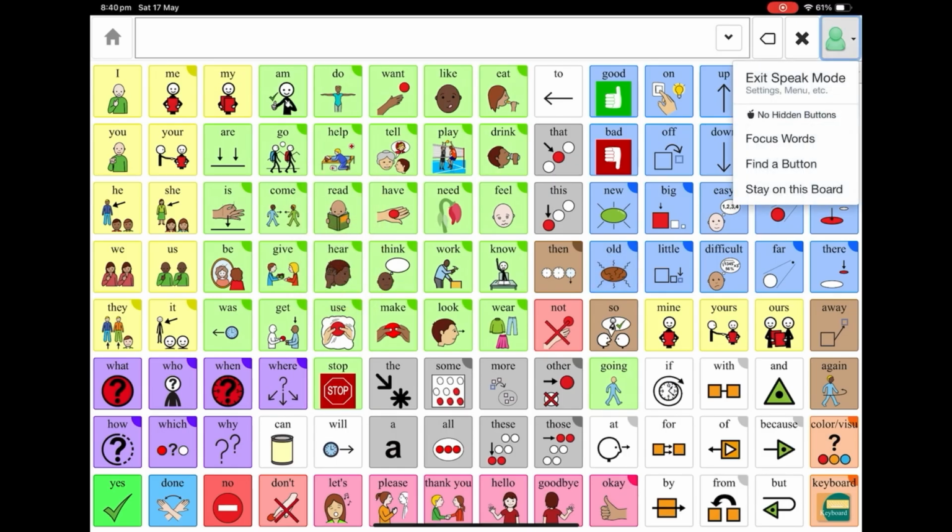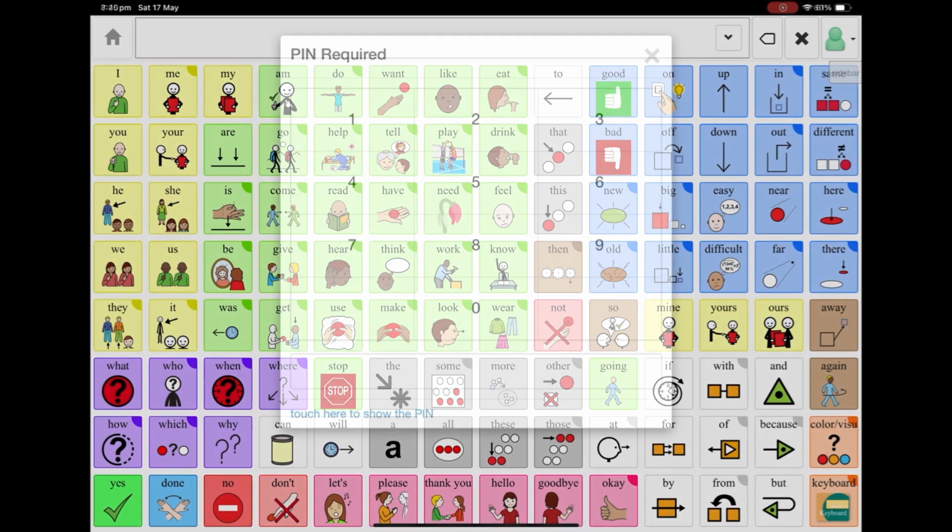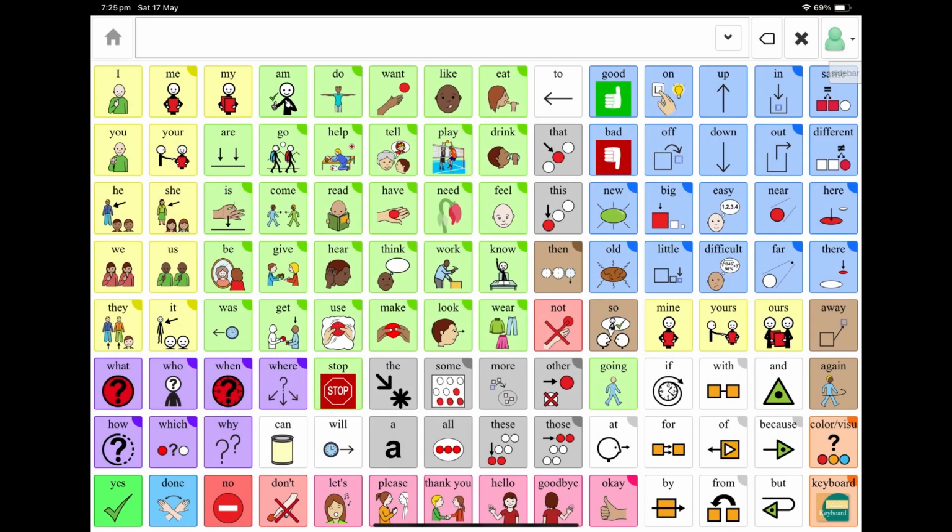You can set up a pin for editing. CoughDrop automatically backs up to the user's account. Grids can be edited remotely via another device or desktop app, with the option for other people to become supervisors. There is also an option for remote modeling.